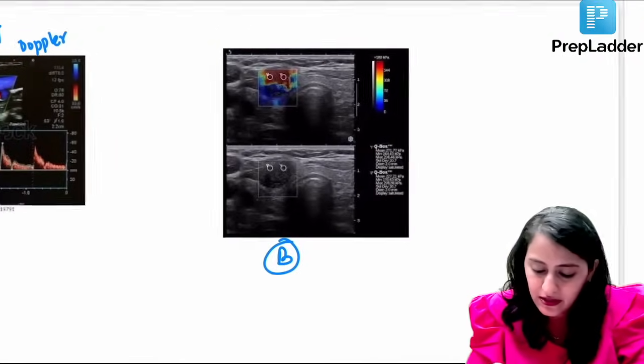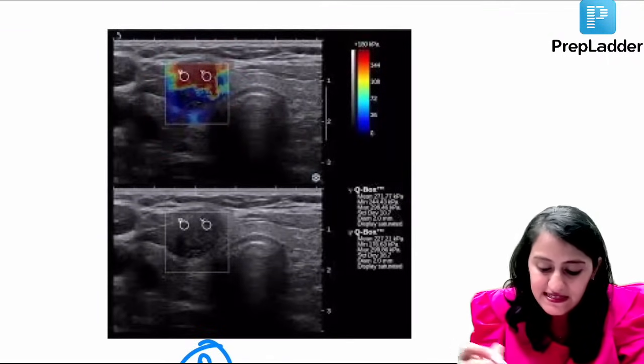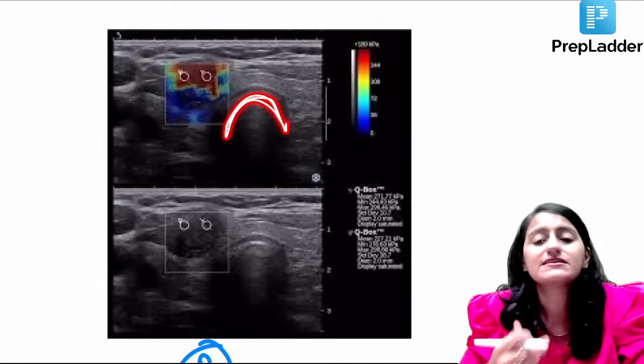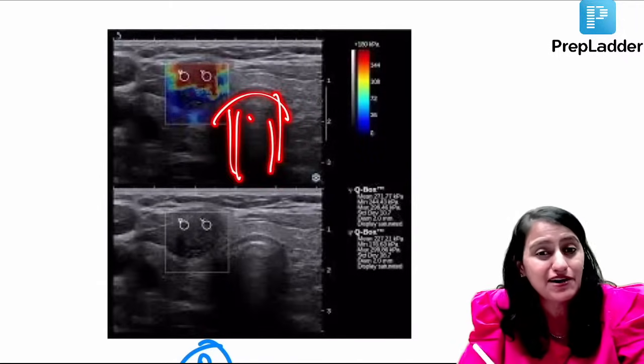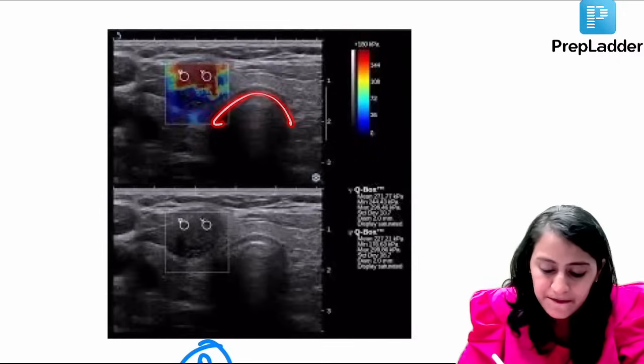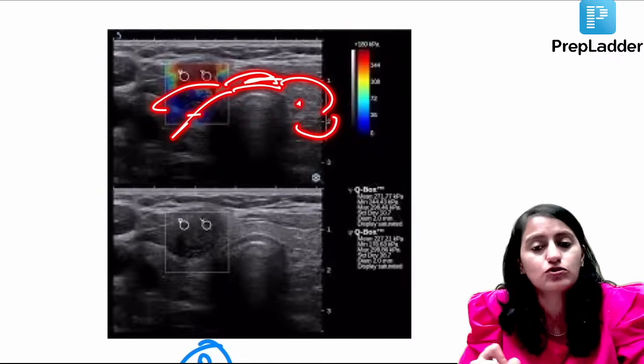And this one here, a colorful ultrasound image is there, but this is not a vessel that you are seeing. This is the trachea. यहाँ पे जो air black दिख रहा है, यहाँ पे पीछे shadow आ रहा है. This is air का shadow. And in front of that, this is the thyroid, right? The isthmus and then the lobes of the thyroid.